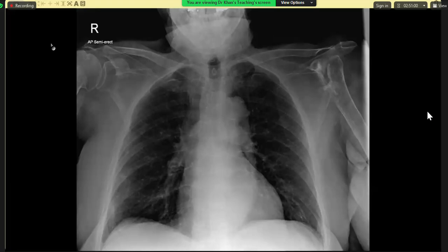It can be due to bilateral humeral deformities. If you are worried about syringomyelia, then how do you explain the finding at the AC joint? At the AC joint, yes, syringomyelia is more of a bilateral process. It is symmetrical and more giving a Charcot joint type appearance with dense, deformed bones. Although there is deformity on the left side, there is no increased density, and it is more like a bilateral superior subluxation. So it can be due to any chronic renal failure, hyperparathyroidism. These are all I can think of.